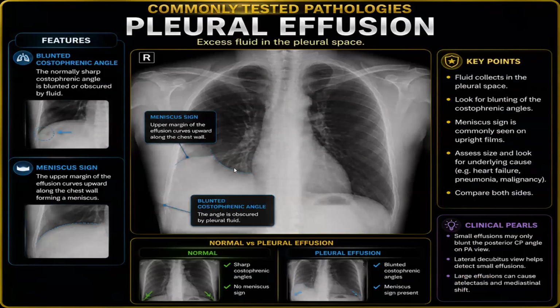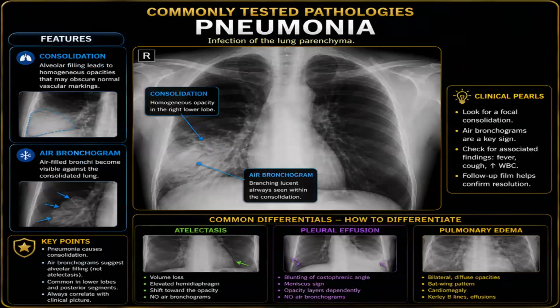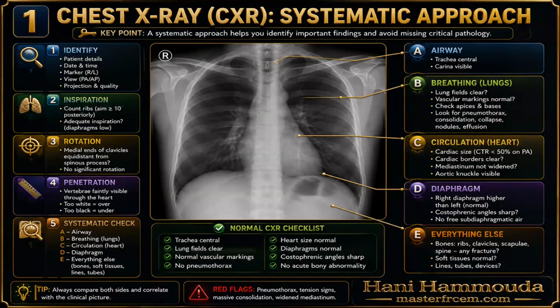And here, massive pleural effusion. It's not about blunting. The part of the lung is absent. Clear? It means pleural effusion, massive. Okay. So I think the station is clear now.